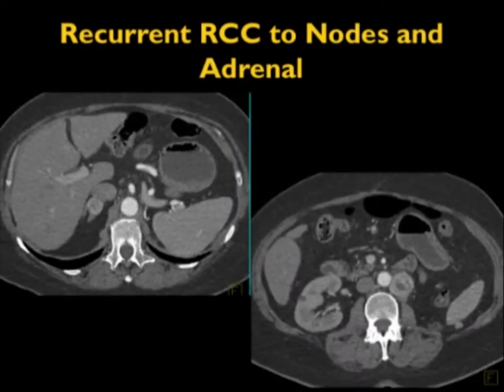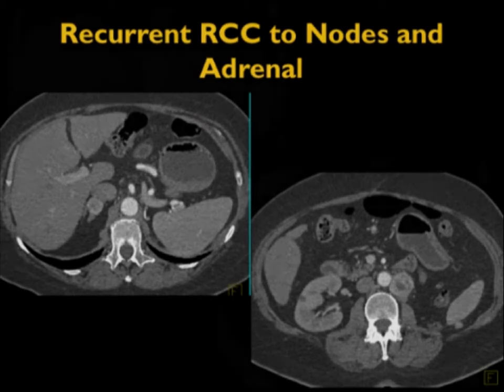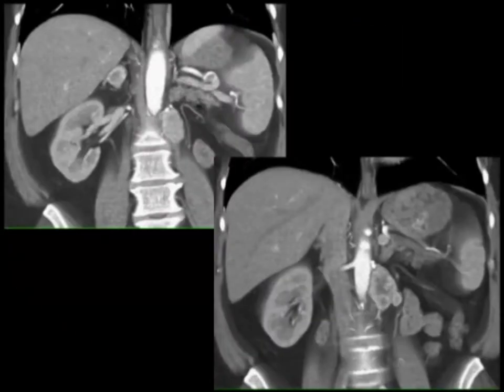But here's another one with vascular mets to the patient's right adrenal. Remember, with renal cell carcinoma follow-up, we always do arterial phase imaging. Sometimes the mets are only seen arterial. That's particularly true in the pancreas. But you can see in this case, adrenal lesions are vascular, and the patient's adenopathy by the surgical bed is vascular. And here that is again on the coronal display. So very nicely showing you both the adrenal lesion as well as showing you the extensive adenopathy.